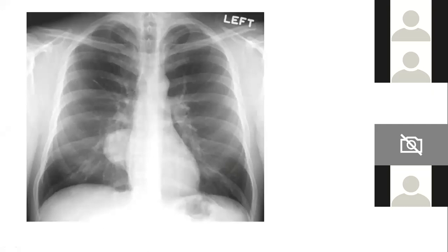What is happening here? These are just for practice, okay? Don't worry about the diagnosis.